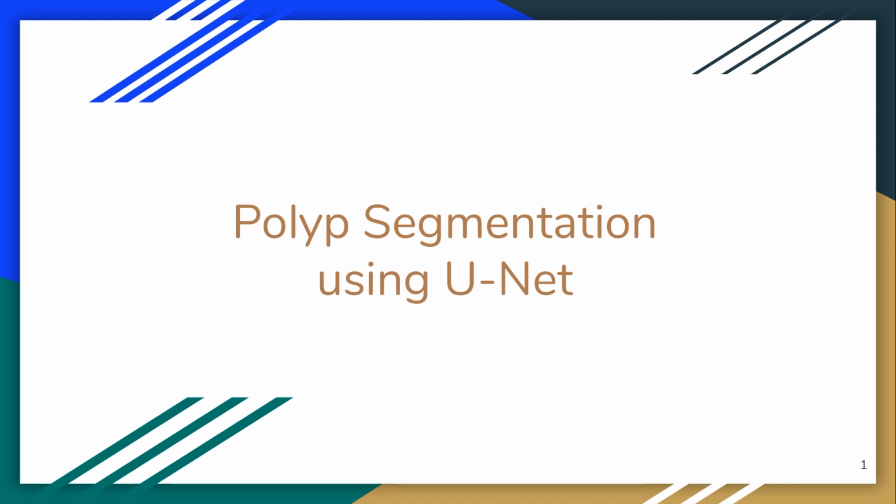Hello friends, welcome to this video. This is going to be another video on semantic segmentation. Here in this video we are going to use UNET for polyp segmentation.